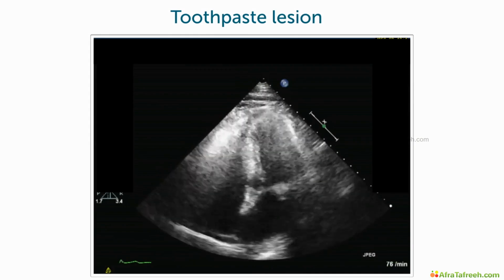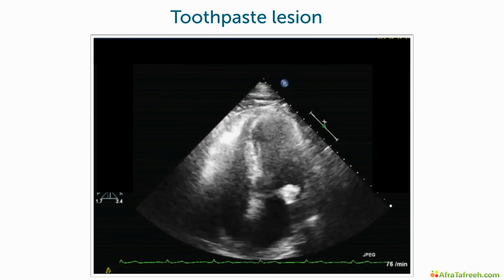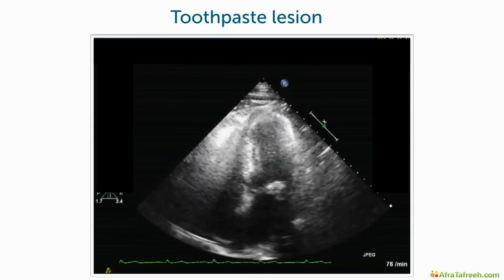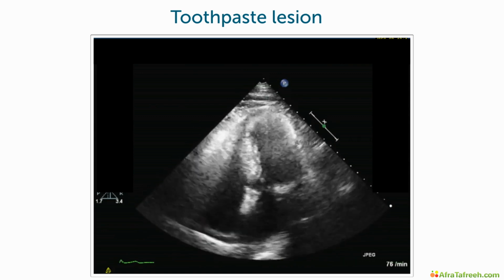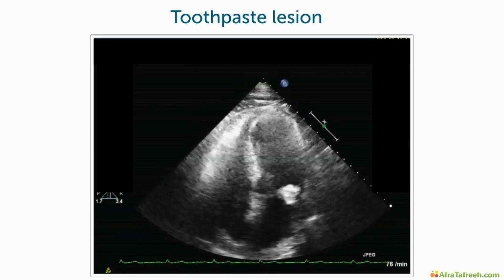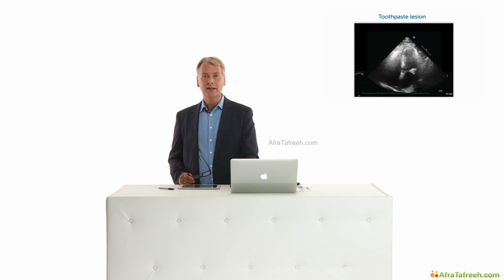It looks very much like mitral annular calcification, with the only difference that it doesn't really go around the rim of the posterior annulus, but is a more round structure. It's unclear what the structure really is and why people develop such a mass. In any case, it's a benign tumor that you do not necessarily have to operate on unless it causes some form of flow obstruction.